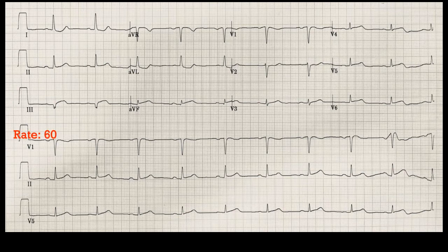Rate, rhythm. It looks like there are P waves before every QRS. P, QRS, P, QRS, P, QRS, P, QRS, et cetera, all the way through. This one just looks a little funky, but I think that's still sinus rhythm. P before every QRS. So this looks to be sinus rhythm. Rate, rhythm, axis. Again, don't worry about it too awful much, but it looks like there's a positive QRS complex in 1 mostly, positive QRS complex in 2 mostly, and positive, in fact, in AVF as well. So this should be somewhere around a normal axis.